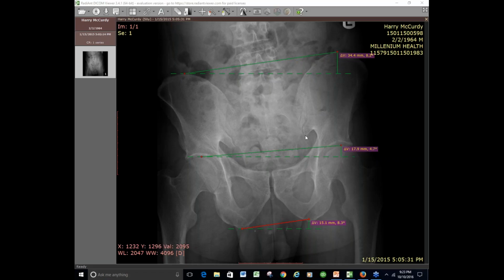Let's say, because what were we doing before? We were subtracting those two numbers, and giving this guy a lift to equal the difference between the two, which was like a 25 millimeter lift, 24. So if I raise this up to 24, you can see how much steeper of an angle that is.